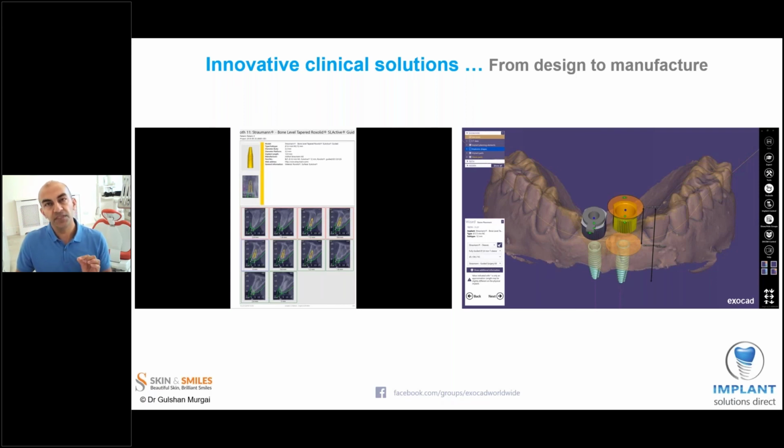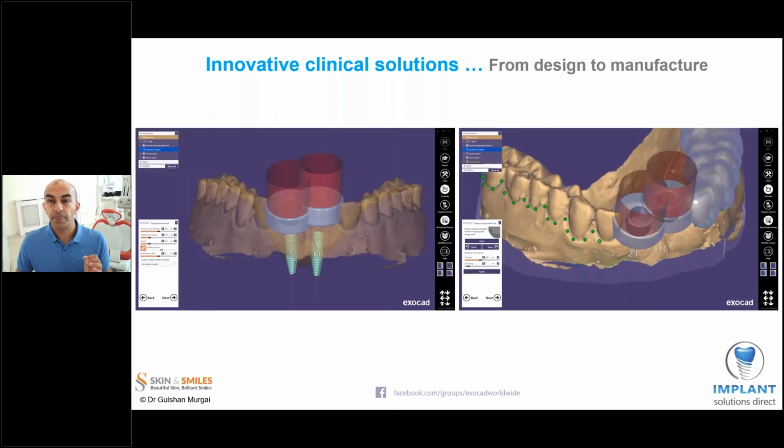So that's very important, and that's the role of the practitioner. That's the final part of their role. Moving forwards now, once that has been done, that sleeve has been positioned, you get to start designing the guide, and these are quite straightforward steps.